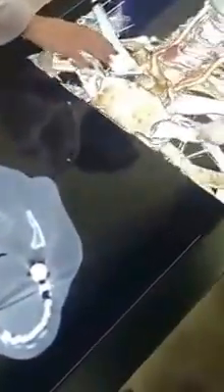And you're not just limited to the head and neck, you also have areas like the brain, large areas like the thorax and the abdomen, all the way down to the leg and foot. And what's most interesting to me is you can load in your own patient's CT or MRI scans, and from there you can get a 3D model of what you're seeing.